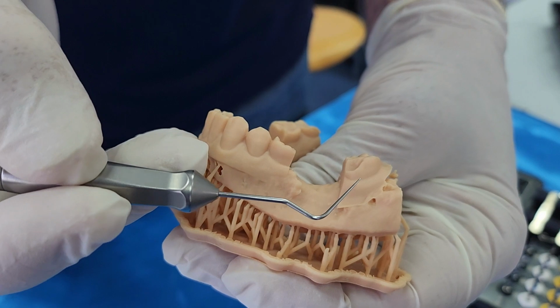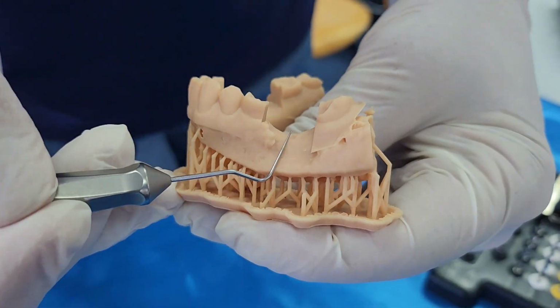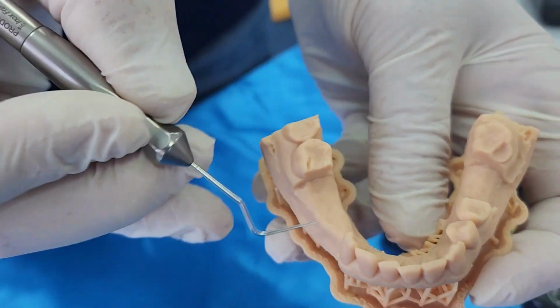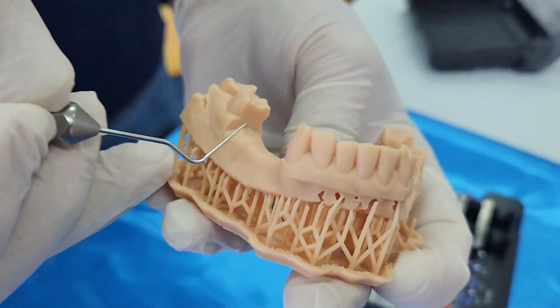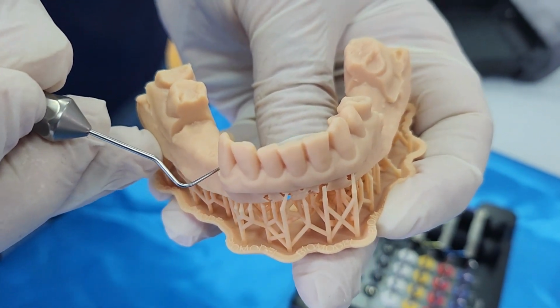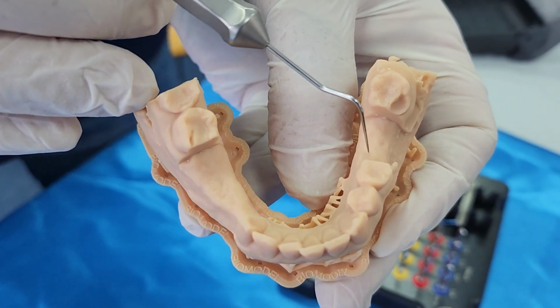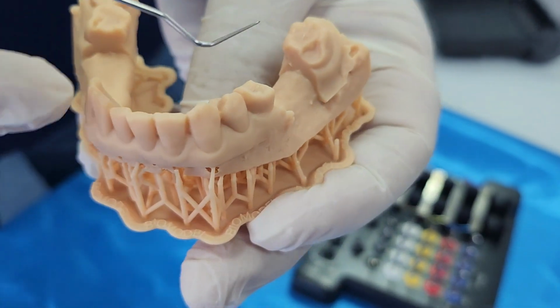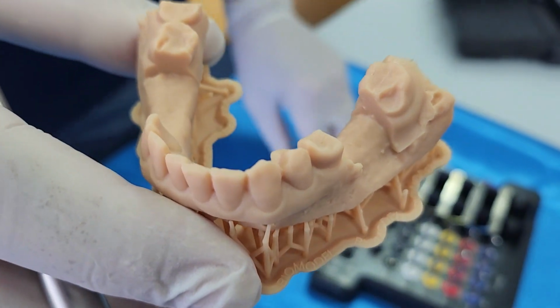Okay, so what you see here, you see the gum, you see the tooth, and here is the bone. It is the exact shade of the bone. On the other side, you see again the bone here and the soft tissue. So he's been able to separate the teeth, the soft tissue, and the bone. So that is exactly what you will have in the patient's mouth when you open a flap, elevate the flap, and then you will get access to the bone and access to the teeth on right and left side.